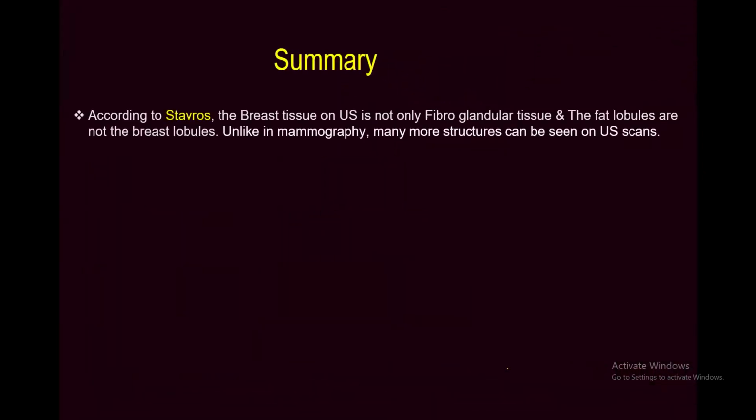Okay, so in summary, according to Stavros, the breast tissue on ultrasound is not only fibroglandular tissue, and the fat lobules are not the breast lobules. Unlike in mammography, many more structures can be seen on ultrasound, as we described.